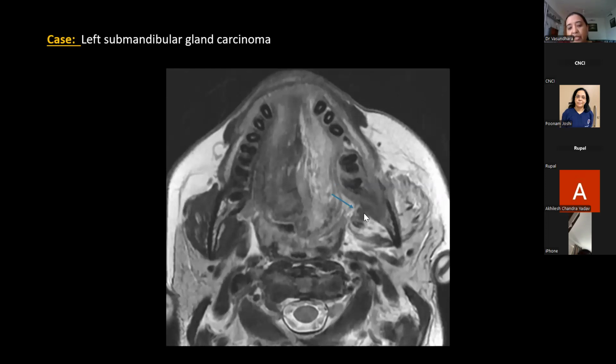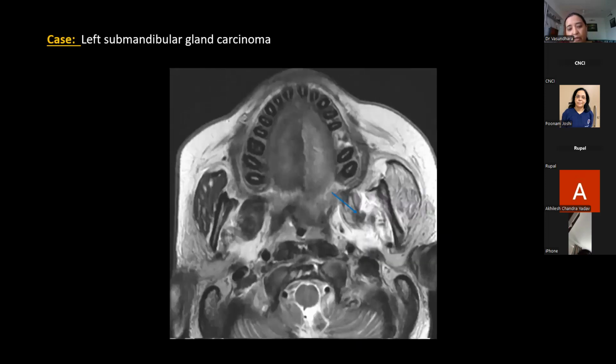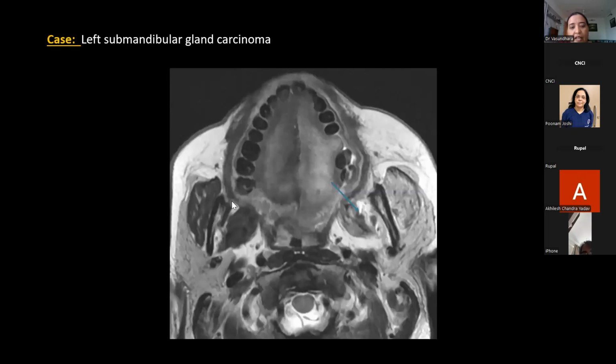Partly, in parts of it, it is seen in all patients on CT and MR. So this is the normal. If we try to trace it on the left side, this is the lingual, this is the inferior alveolar, this is the auriculotemporal. Sorry, I'll go back. It will cross this, come over here. Partly it is seen, at least the perineural, if involved, will be seen.